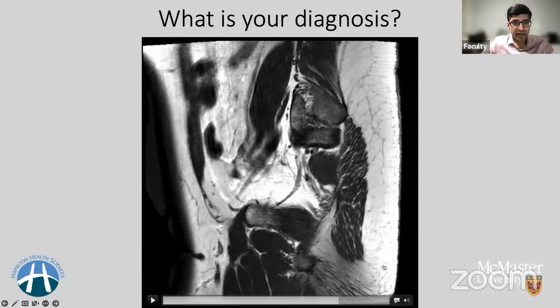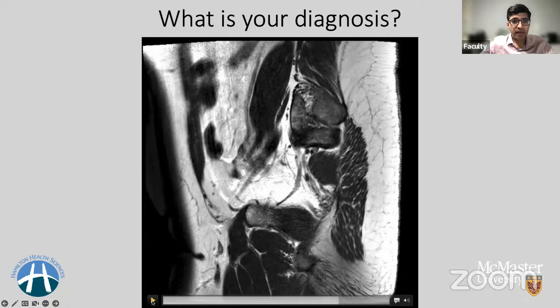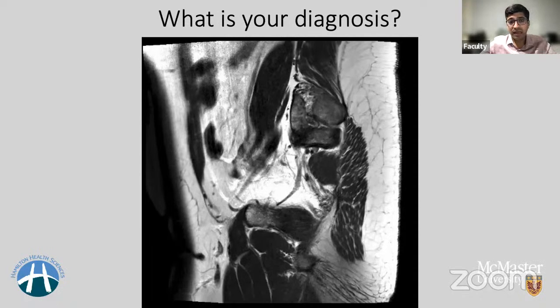Again, you see dilated tubes bilaterally with non-simple fluid. In this case, the MRI with contrast did not show any enhancement. So this is in keeping with a typical O-RADS MRI 3 lesion because it is dilated tubes with non-simple fluid.